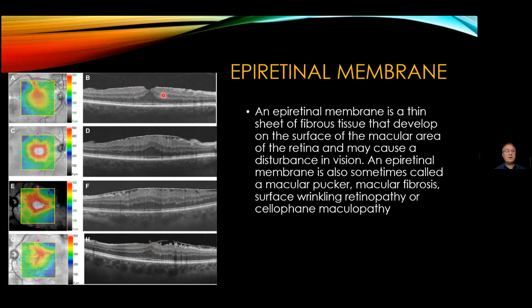In this case, if someone is sending me some images to give them an evaluation and saying, how often do we have to see them, or when do we have to see them? I might say to the individual, if the patient still has normal vision and no metamorphopsia, to repeat the scan in 3 to 6 months and give them an Amsler grid to do a home test. And if they start dropping vision, going down to 0.8, 0.7, 0.6, or having distortion on the Amsler grid, the patient must be evaluated.